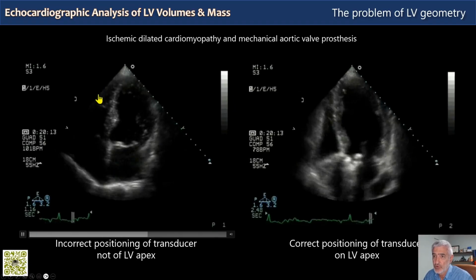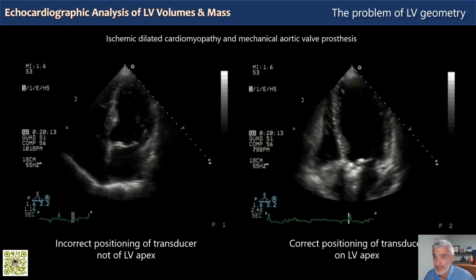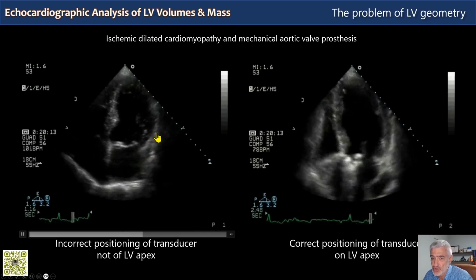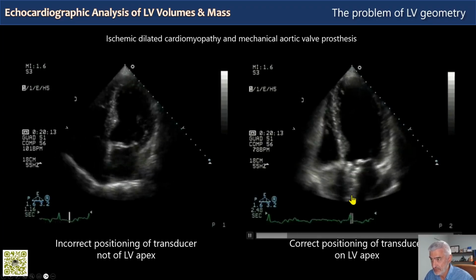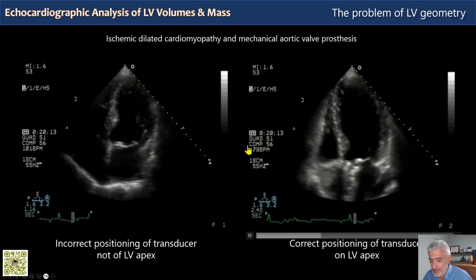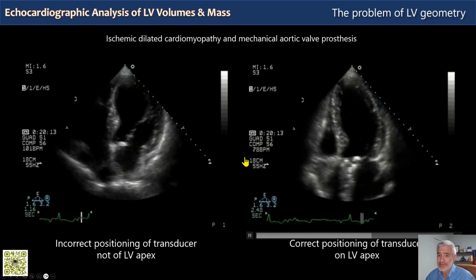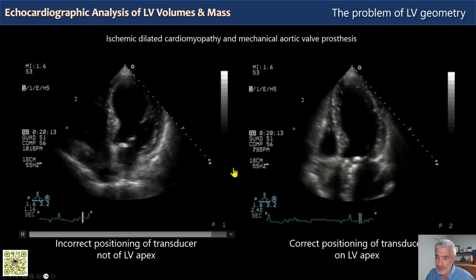Here too, this recording on the left, which is what happened in real life, appears correct, because the long axis you see is almost double the short axis. But there is instead a marked foreshortening of the long axis in this four-chamber. If you compare it with this one, which is the correct one. What makes us immediately decide which is the best of these two views, which is the geometric difference that we can see immediately, qualitatively, that makes us decide which is correct and which is not?